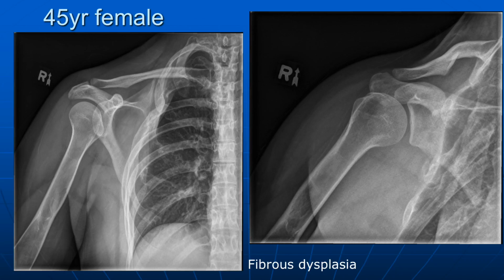So the fact that there are multiple lesions may or may not help you. If you think it's metastasis, that's going to seal it for you because you're going to say, oh, there's multiple lesions, this is metastasis. And I don't think you'd be wrong to say it could be metastasis. You'd want to see it all. To have this many lesions, the patient's going to have a known syndrome. Have you heard of McCune-Albright syndrome?